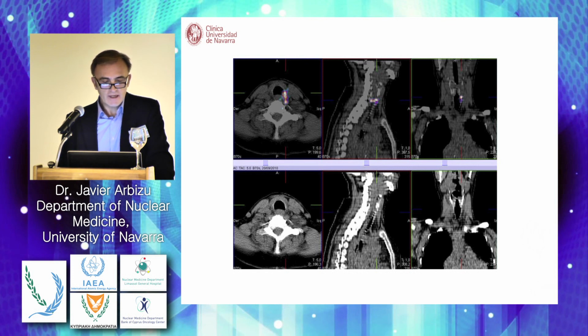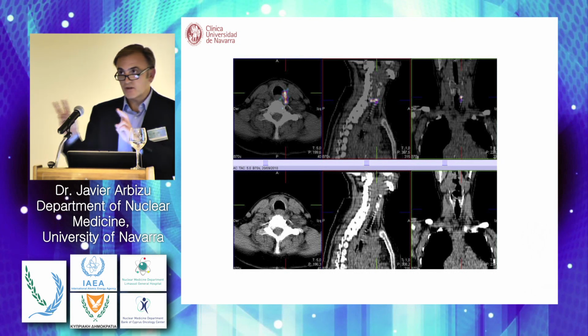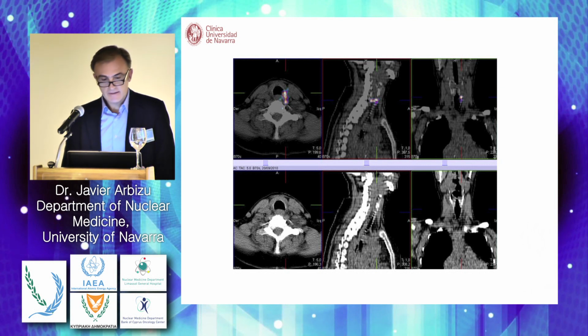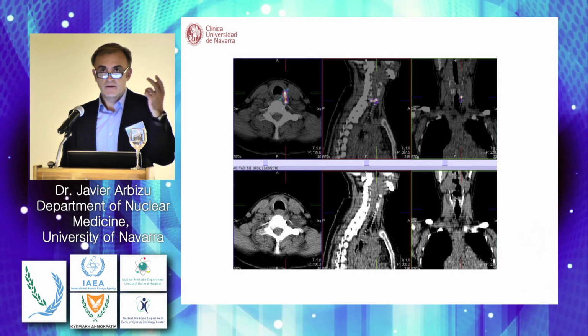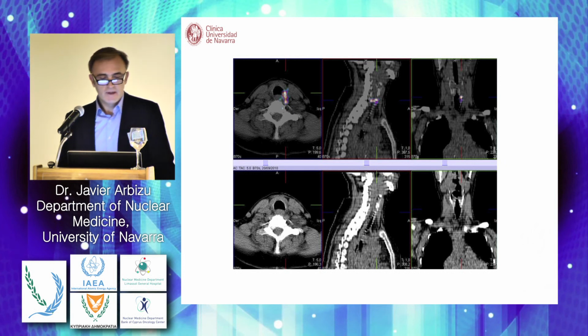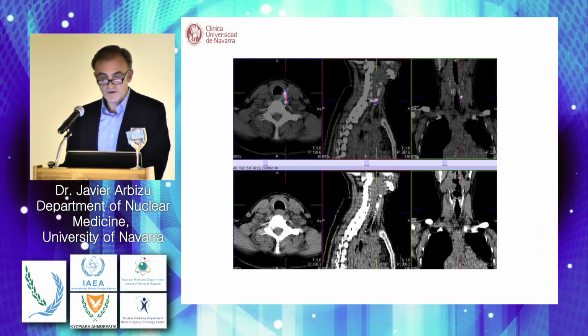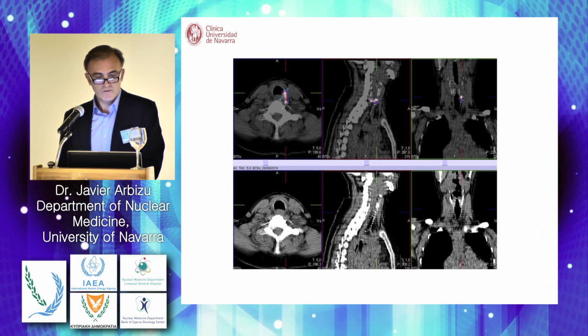One was posterior, and here you can see very clearly the focus on the CT with high uptake, but also there was another one behind, which is a remnant of the normal tissue. So there is the presence of both. So maybe you can say this is remnant, and here you can see there is remnant plus lymph node metastasis, which is very clearly seen in the CT. So the CT is also important to remark.